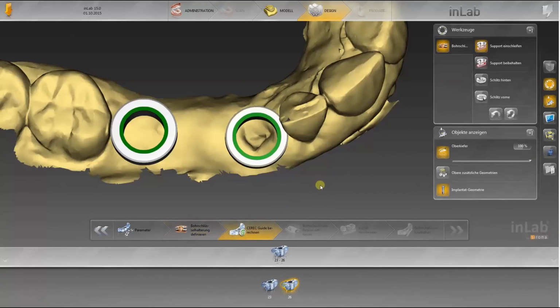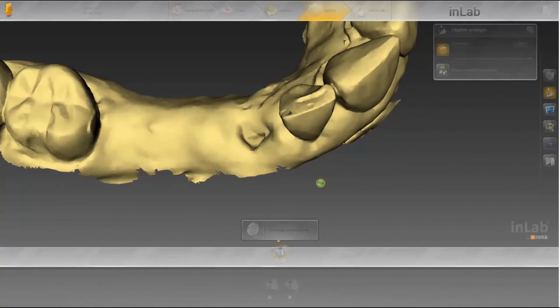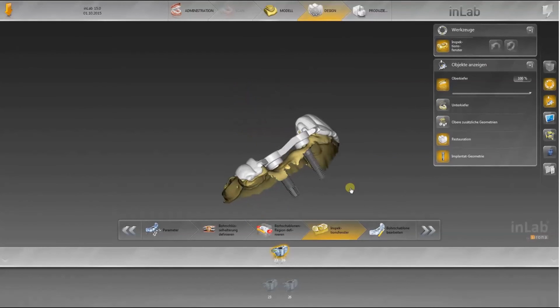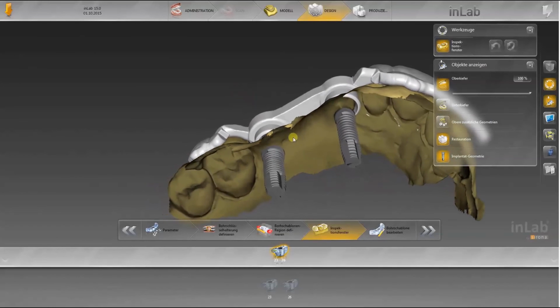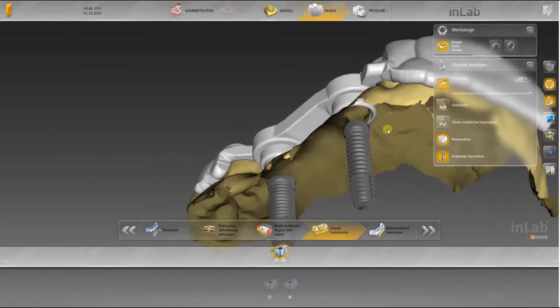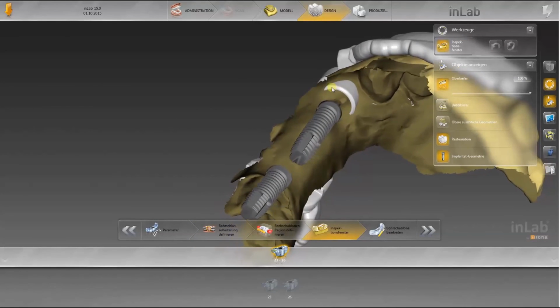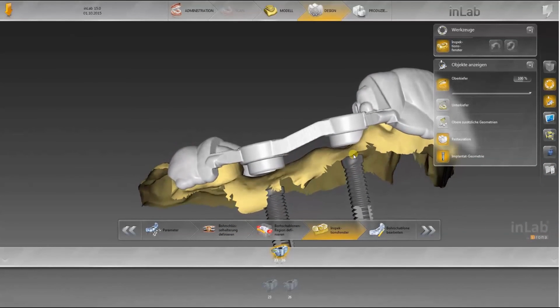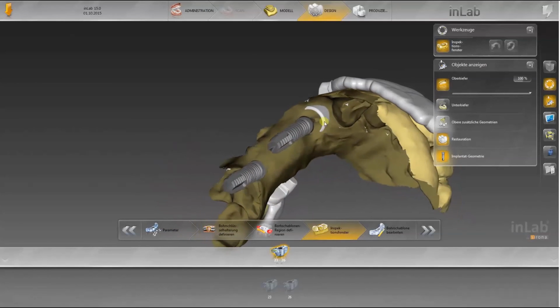In the next phase, the CEREC guide is calculated. The surgical guide is calculated and its position in the disc is displayed on the screen. Now, go to the step Inspection window. You can now see that the drill sleeve no longer penetrates the gums on the side where the support was ground out. On the other side, the drill key sleeve is penetrating the model. This illustrates the importance of precisely adapting the support to the jaw situation.